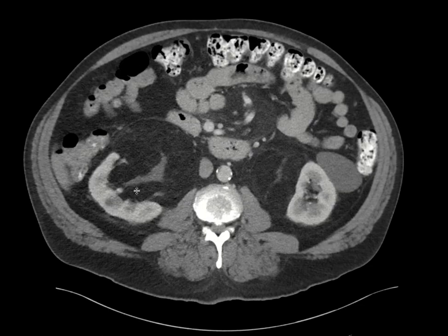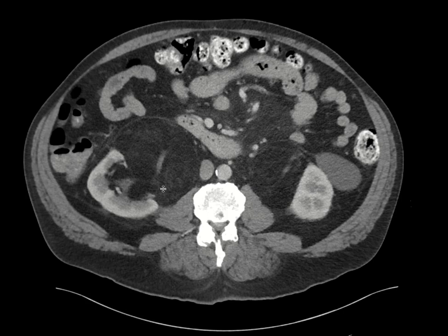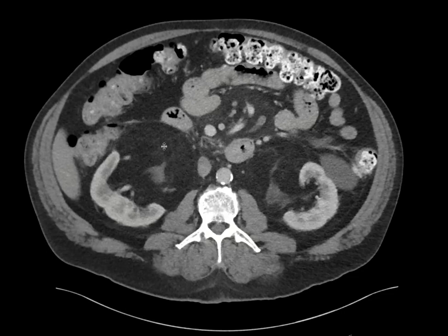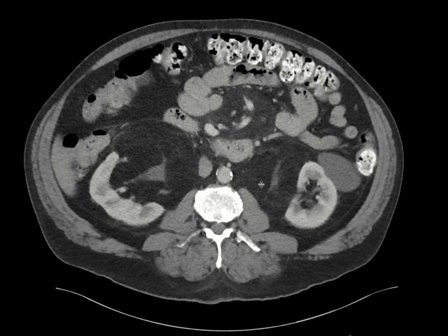And then finally, another thing we could think of is fatty tumors involving the kidney would be an angiomyolipoma. This does not look like an angiomyolipoma. This is involving the renal sinus, and it doesn't really have too much soft tissue component. So this is really a case here. This ended up being biopsied just to make sure that this is not a liposarcoma, which would be unusual given the fact that it's bilateral.